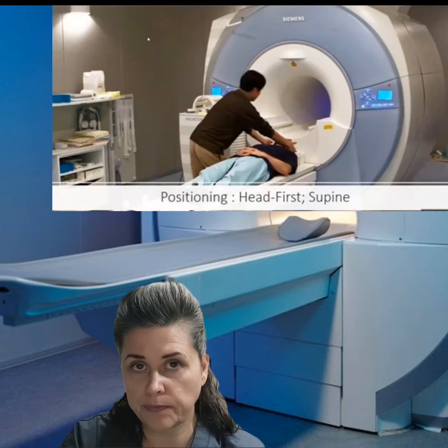Let's talk about the circle of Willis. The axial block scan we run only for MRA of the circle of Willis. We want to use the most powerful coil for that. It is the neurovascular coil. The second choice would be the 8-channel HD coil, and if we don't have it, a birdcage coil will also work. The landmark for the circle of Willis would also be glabella. It's exactly the same as for the brain.